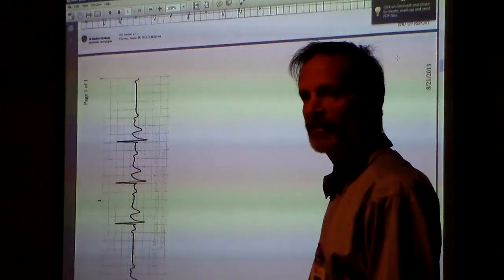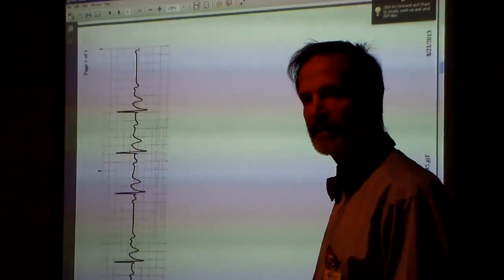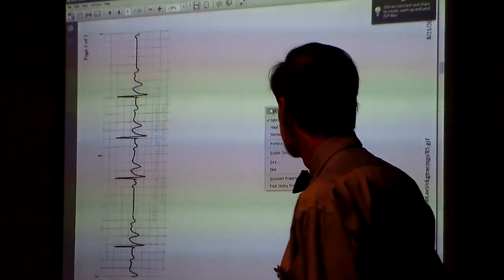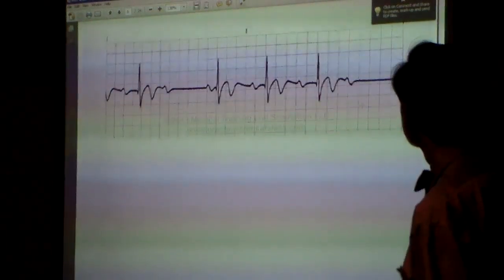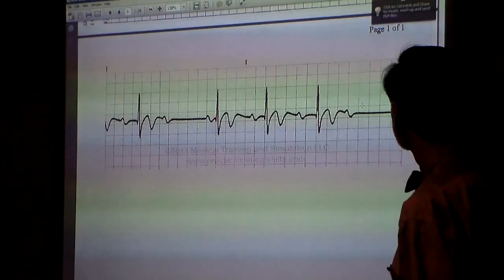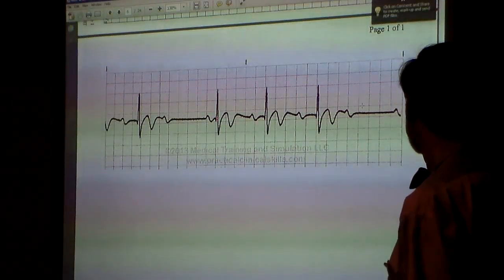Okay. Can we turn that, or do we have to all lie on our side? No, you can. Can we do that? Yeah. Let's see what it says, view. There it is. Okay. It's not upside down. All right, so this is a common thing we see.